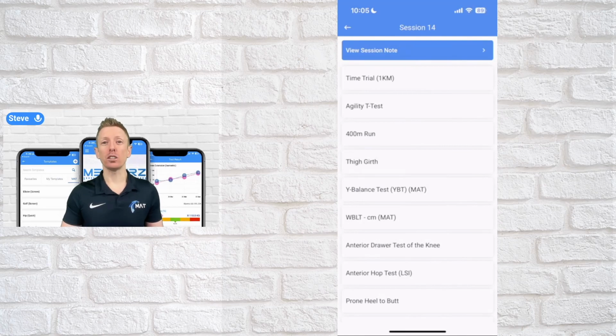In this video, we're going to talk about all the data you can collect with the Measures app and go deep diving into the results screen. The results screen's been particularly designed for your clients as much as for you and your team. The reason is we want to enhance the communication, which we found that previous systems out there on the market just don't allow you to communicate the results meaningfully with your patients and clients.